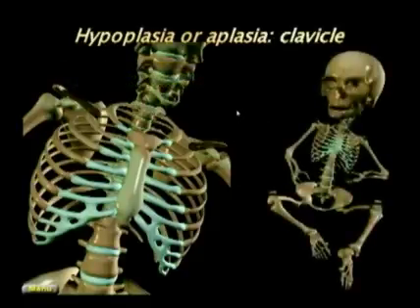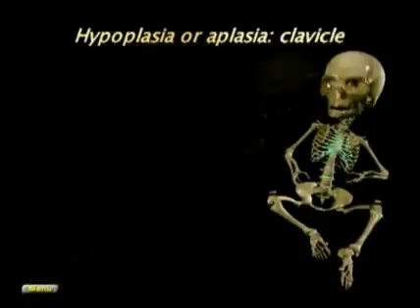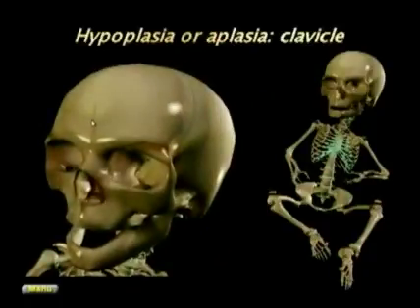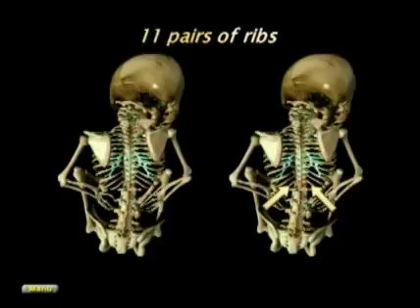Now, babies that have the cleidocranial dysplasia also have a very striking finding. If you look at the skull, at the level of the metopic suture, instead of having the metopic suture in front of the two lateral projections of the frontal bone, the metopic suture is actually posterior, and there is some frontal bossing that is to the side of the metopic suture, not in the middle of it. Very typical of cleidocranial dysplasia. And by the way, those babies also have a delayed fusion of the mandible, another finding from that condition.